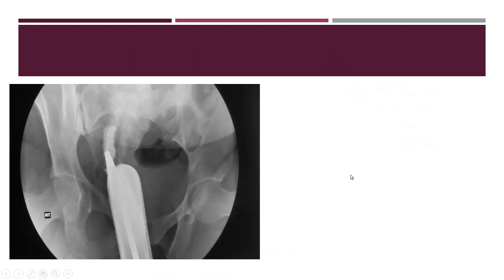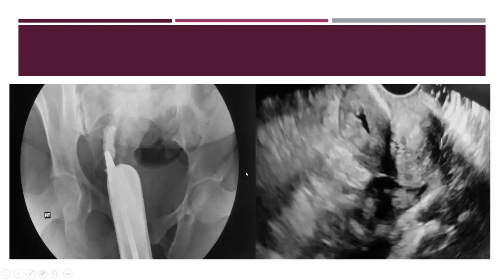Sometimes the synechia is so extensive that we cannot delineate the uterine cavity at all. Here we just see the cervix with its plica palmata. There is no uterus above that we can see. On doing ultrasound, the endometrium is nearly not present. Minimal fluid is seen in the cavity, mostly due to obstruction. There is extensive Asherman syndrome. So this is an Asherman syndrome.